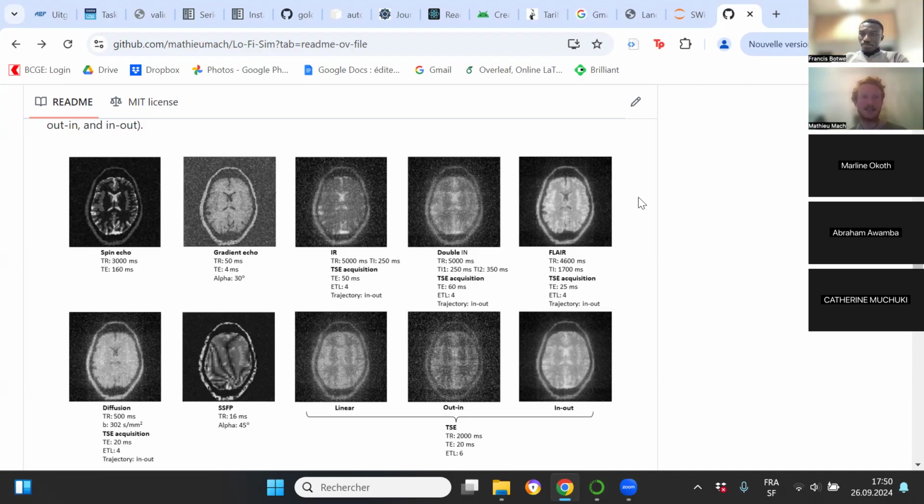Yeah, it was one of the main goals. If you want to practice on a real scanner, sometimes it can take some time. You need a volunteer or a phantom that you don't have. And we wanted to kind of bypass this a little bit and offer any user as much, or limited, time of practice, basically. So it's mimicking reality, but it is not reality. So we're trying to get as close as possible. As of now, this is where we are. Still room for improvement, but yeah.